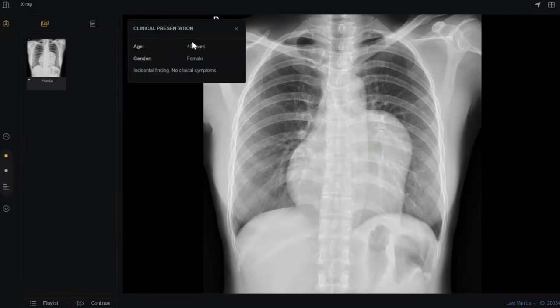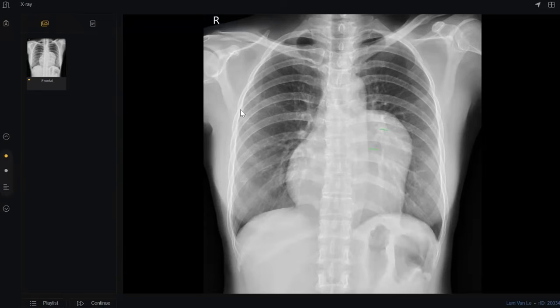Okay. So this is an X-ray chest frontal projection of a 40-year-old female patient. Here I can see a well-defined homogeneous opacity projecting over the left lower zone. It is showing a well-defined lateral margin and merges medially with the mediastinum, and I can see hilar vessels through it. So the hilum overlay sign is positive, and I cannot see a heart border separately, so it is simulating the left heart border.